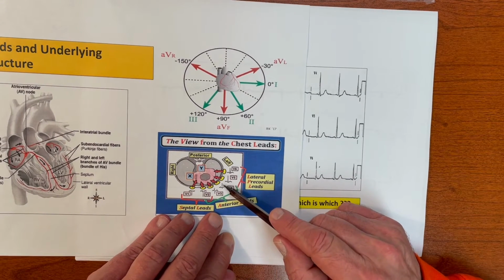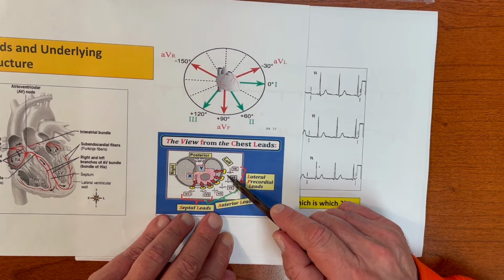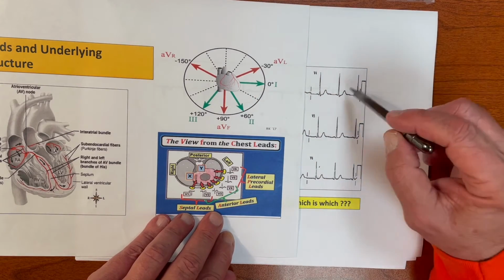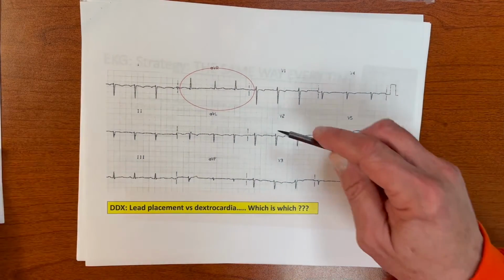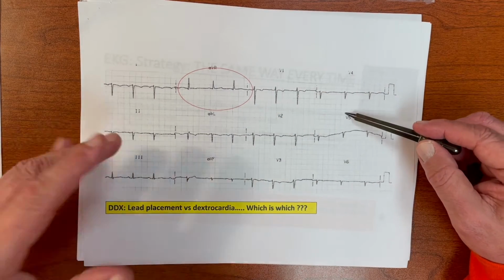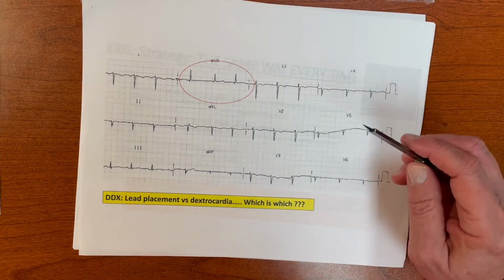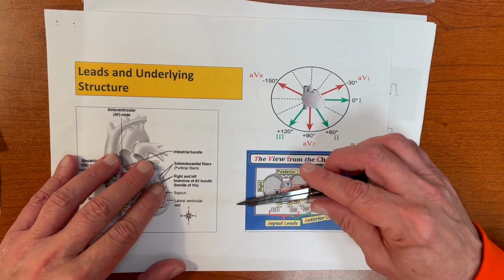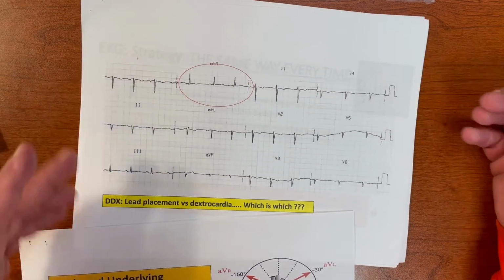I don't know if you can see that adequately on this small tracing, but notice as you go over more of the left ventricle, you get a bigger and bigger R wave. And here at V4, you have what looks like a normal R wave, meaning there's muscle under that lead, as opposed to this EKG, where everything is up, up, up, and instead you have nothing but negative complexes, just like you were talking about. Okay? That's because everything is going away from those leads. Everything's over here. So the vector's like this, meaning away from, meaning negative component.